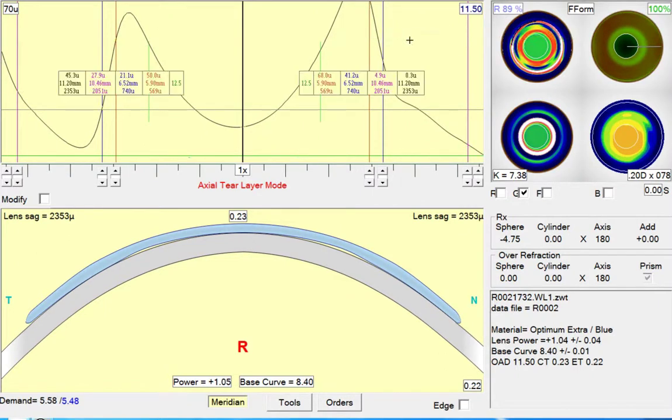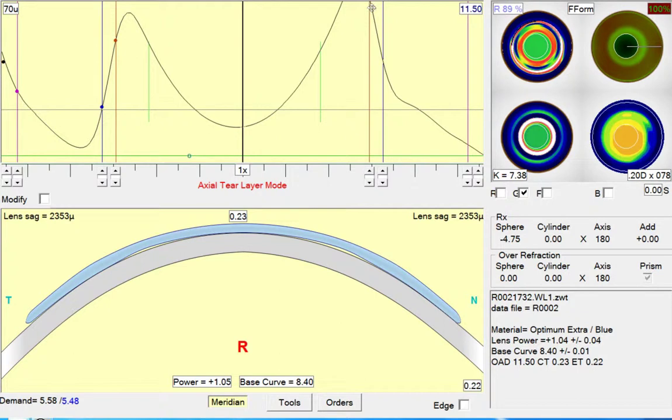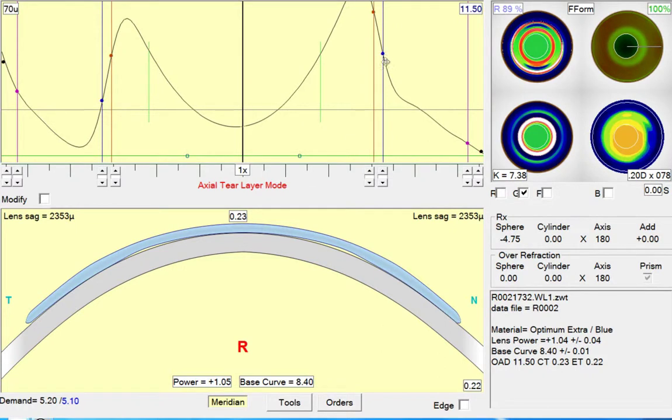And then when we do that, we can go back here, we can see that the red, the OZ, and the blue, the IC control points have also shifted outward. They started out at 5.6 millimeters and 6.2 millimeters, so they've both shifted out about 0.3 millimeters. With this patient, I'm going to probably try to go out a little bit farther. Maybe we'll go to a 6.1 and then a 6.7. So I'm just going to drag outward 6.1 and then drag outward to 6.7.